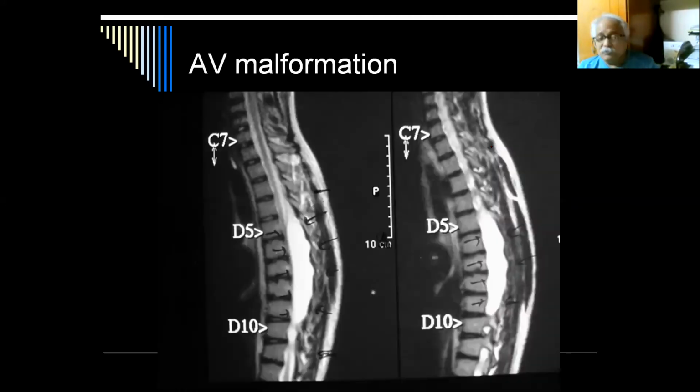So if you just remember what is bright in your T1, what is bright in T2, you can know. Even in the spine you can do contrast, just to know what is metastasis, what is infection. Two, three things you will see in the spine, being an orthopedic surgeon in your MSK or DNB career. One is the disc, one is tuberculosis, one is hemangioma you can sometimes find, or else you can find epidural abscess, post-discectomy discitis, or tuberculosis, or any other infection and tumor.